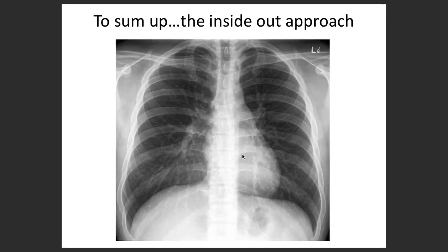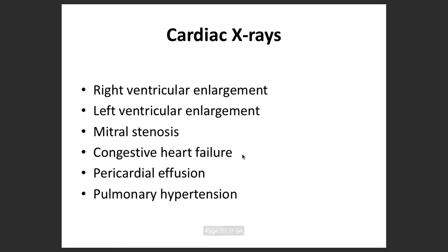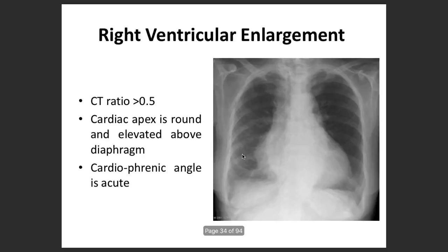Okay, so now since you all have become really big experts, let's try to show you some of the pathological chest X-rays, especially in cardiac conditions. We all are in cardiology, right? These are some of the common chest X-rays in cardiology which we come across. So let's have a look. What is happening in RV enlargement? The diagnosis is already given.